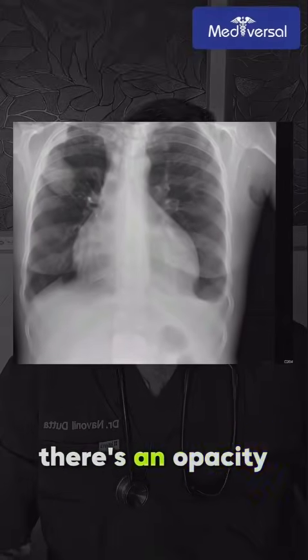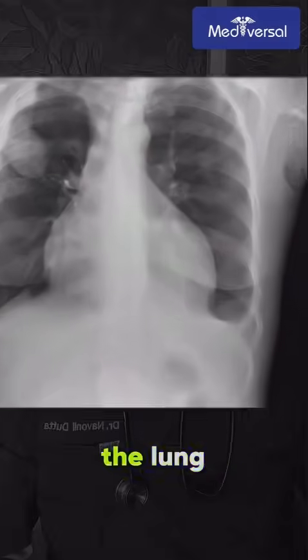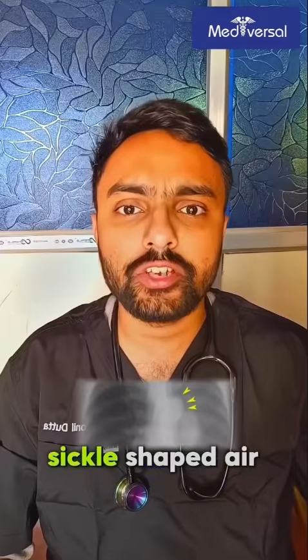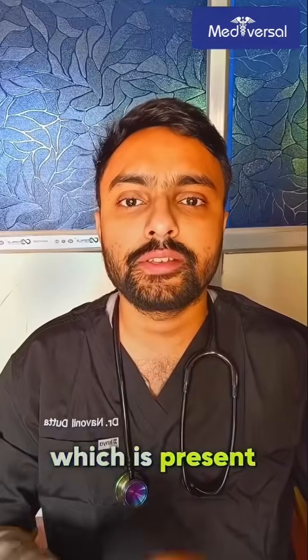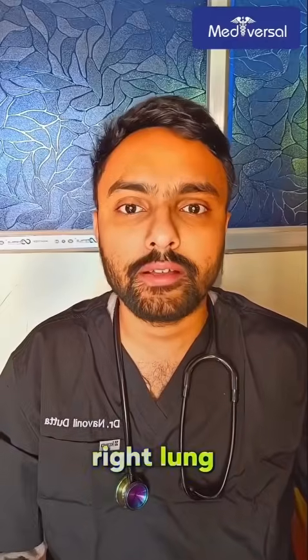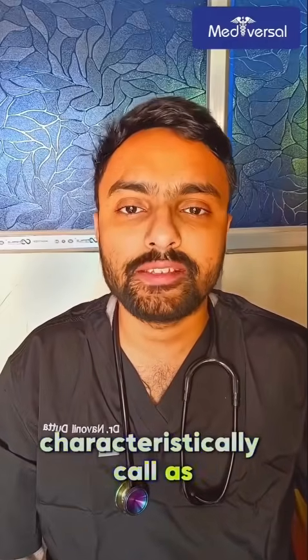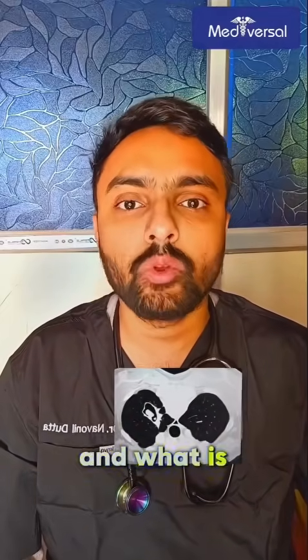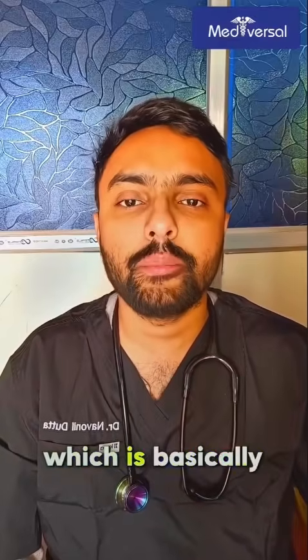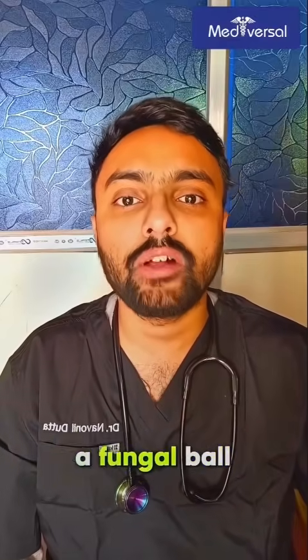Based on all of this clinical profile, when you look at the chest X-ray, you'll be finding that there's an opacity present in the right upper lobe of the lung, which has a narrow crescent of air in it. This crescent or sickle-shaped air, which is present in the opacity in the upper lobe of the right lung, is what we characteristically call the Monod sign. And what is Monod sign seen in? Monod sign is seen in Aspergilloma, which is also commonly called a fungal ball.